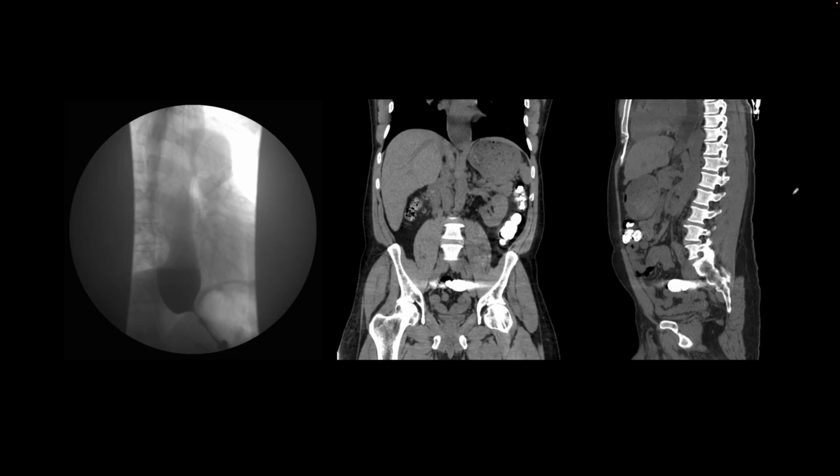This is our next patient. They had presented with dysphagia, and we had performed an esophagogram where we find on this image on the left a dilated esophagus layering contrast, and near the GE junction we see that there is severe narrowing in an appearance which is called a rat tail appearance. These are some corresponding findings on their CT that was acquired without IV contrast, and these findings are characteristic of achalasia cardia.